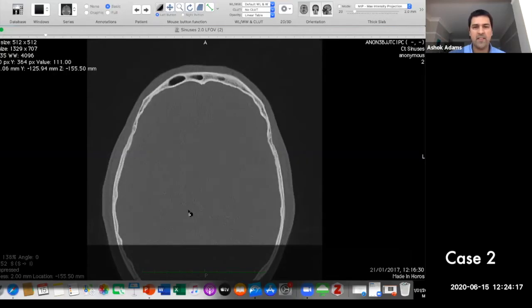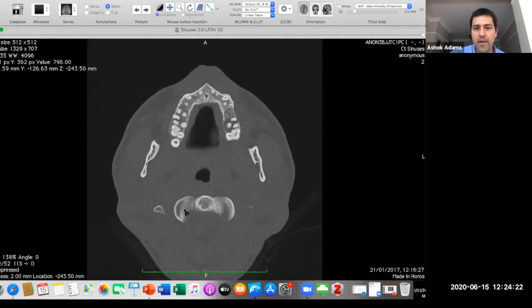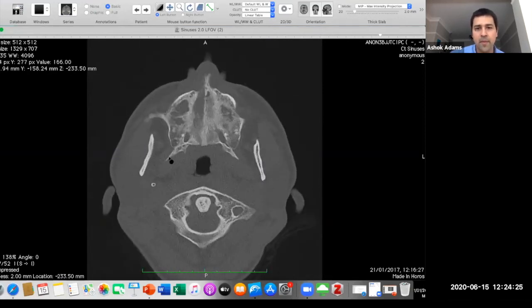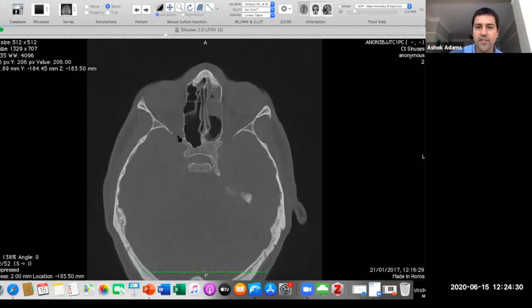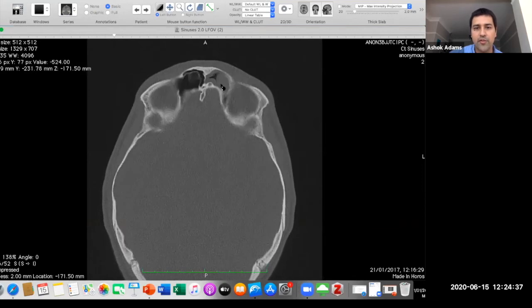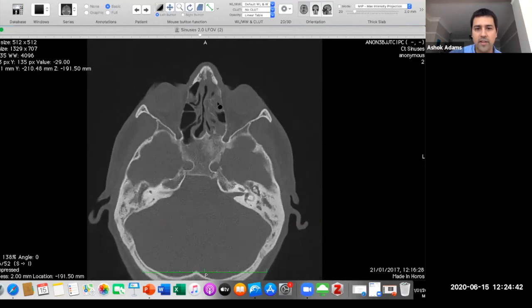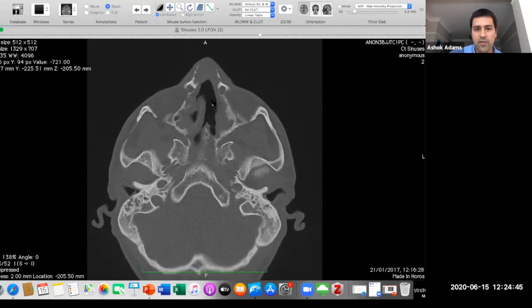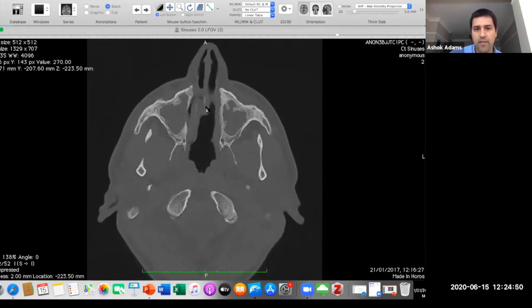Right, the next case I'm going to show you is, again, just to put as much information as possible for your radiologist. Typically when you've got absent structures in the sinonasal compartment, there's always a tendency to think the patient's had previous sinonasal surgery. This is in the axial view, on the bone windows. You can see some mucosal thickening there, the frontal sinus recess, anterior ethmoid air cells. Then as we move further south, the normal septum is missing. You've got a septal perforation.